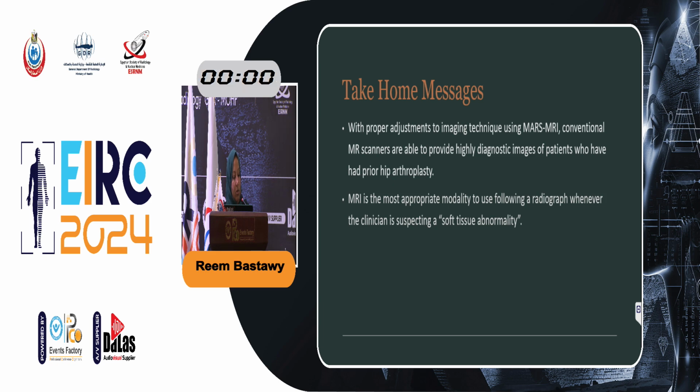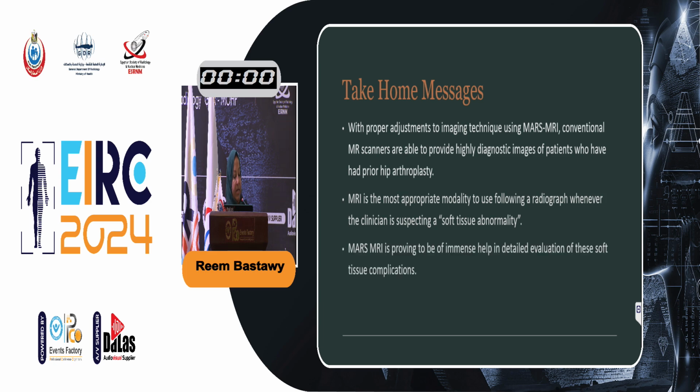MRI is the most important modality to use following a radiograph whenever the clinician is suspecting a soft tissue abnormality. And metal artifact reduction sequence is proving to be of immense help in detailed evaluation of these soft tissue complications.